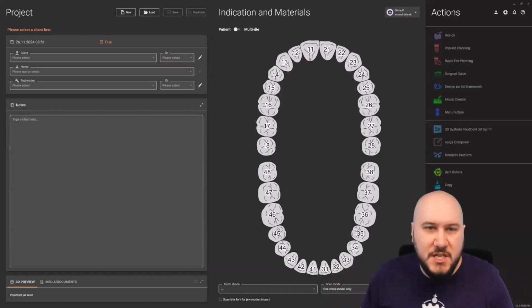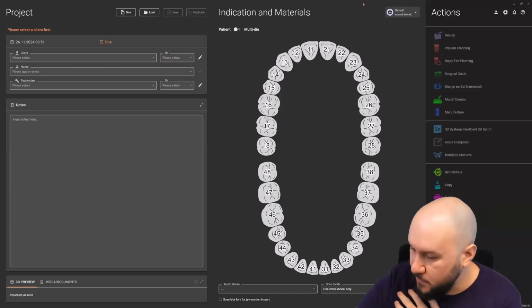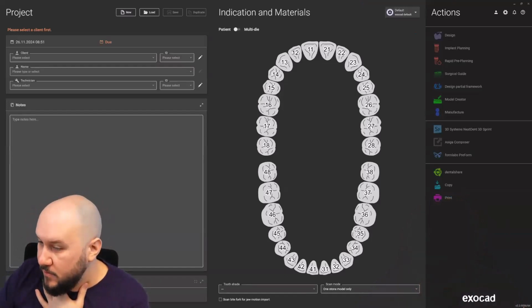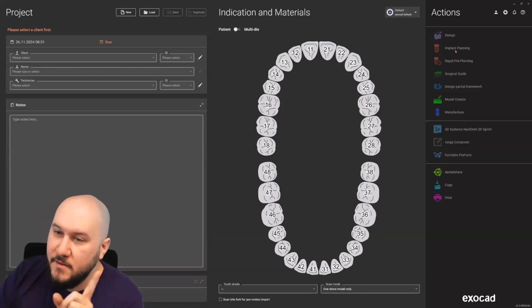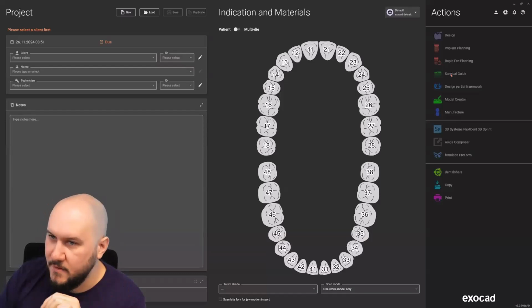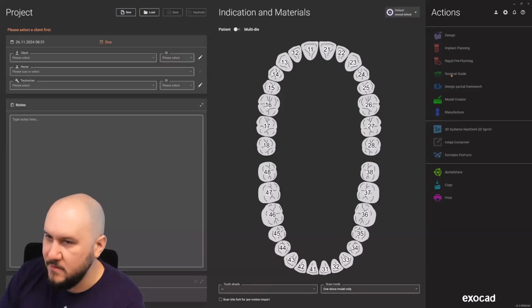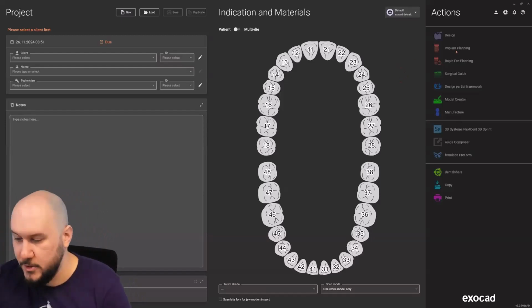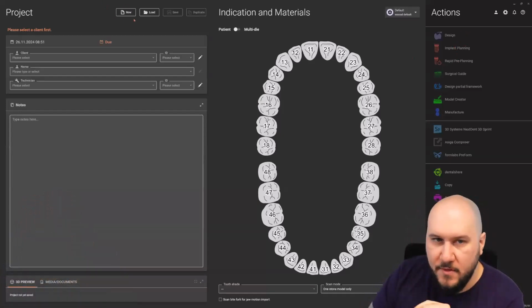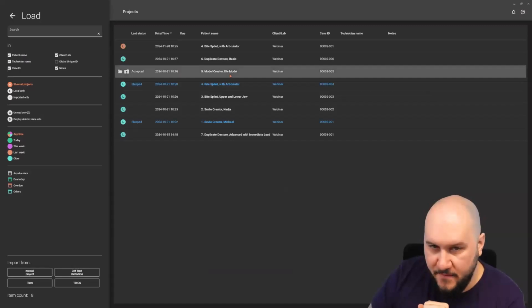Okay, I think what you see here directly is that we have a little bit of changes also in the DentalDB. I can show you directly when I'm just going on the left side. We have the 9036 here available. Everybody's familiar, I guess, with the direct printer integration, but also what you can see directly here is that we have the implant planning, the rapid pre-planning, and the surgical guide. So the immediate load function is more or less better because we now have the complete options that we had here in the exoplan integration directly. So it's also easy for your reseller to install that for you, so that you can use DentalDB directly for planning and for the CAD functions. Like you see here, implant planning, everything is set up by default. They have to do the installation for you. Super easy.